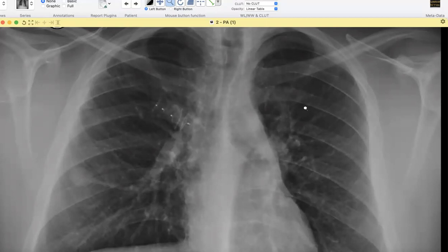Well, although I can only appreciate one lesion, since the appearance to me seems quite typical for it, I would want to look for further lesions. Do you think it is high or low based on what you're seeing right now on the X-ray? Is it low? Is it in the middle somewhere? I would say it is high. Okay.